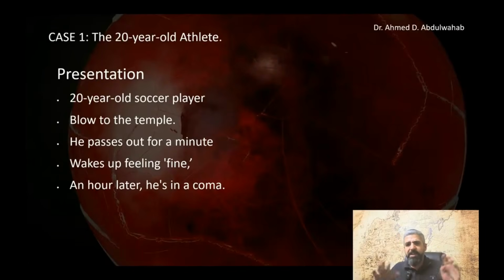Case number 1 is a 20-year-old soccer player, or football player, who takes a blow to the temple. He passes out for a minute, wakes up feeling fine, then an hour later, he's in a coma. The classic lucid interval. So let's look at the scan.